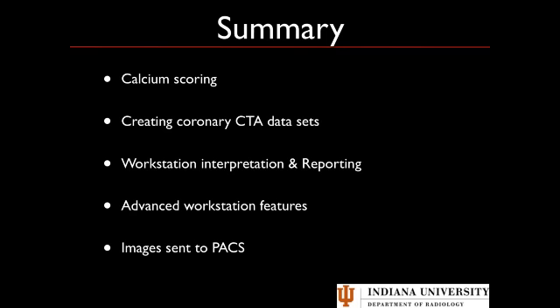I have no problem with people using these advanced workstation features provided they learn how to do the interactive 3-plane MPR first. The main thing with doing that is you know that that's always going to work regardless of the severity of the disease. If you've got a patient that really has significant disease, the automatic segmentation tools are probably going to fail. Make sure you can always fall back and do an interactive MPR 3-plane evaluation. Otherwise, feel free to use the advanced tools, especially if you're doing quantitative functional evaluation. They work very well.